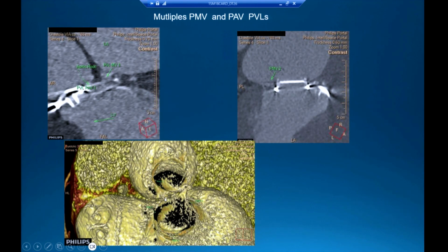It represents the same defect of the crux, but at the same time the patient also had a very large paravalvular gap in the posterior portion of the mitral prosthesis. In echo and TEE, you can clearly see two different separate jets. That's important. Once you find one, you can't stop. You have to keep going and make sure you see them.